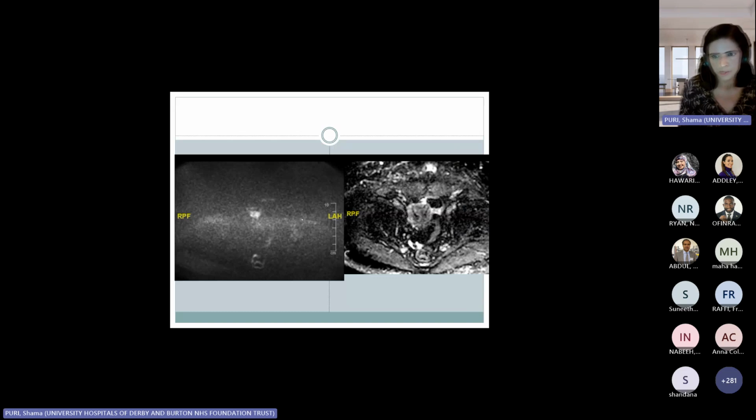Coming to diffusion weighted images, they are quite important to understand because we use them in sarcoma, leiomyoma differentiation as well. So you look at 2 sets of images. This is called DWI images, and this is ADC map. Cancers are bright on DW and dark on ADC. The anatomic resolution of these images is very low. As you can see, you can hardly see any anatomy. So you have to correlate them with your other images, where the anatomy is seen, so you know where you're looking. So this is a cancer, bright and then dark on ADC map.